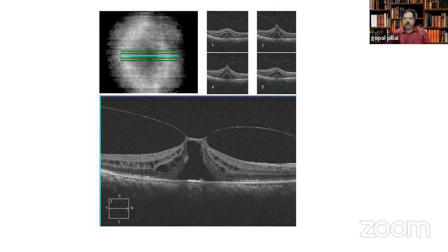During surgery, one important thing is that there's a very thin roof of that particular vitreomacular traction. If you just pull on the vitreous and cause a PVD, that roof can be de-roofed, which means it will form a hole. So we have to carefully trim around this particular area of traction so that a bit of that tissue can remain on either side of it without an attachment with the rest of the vitreous.